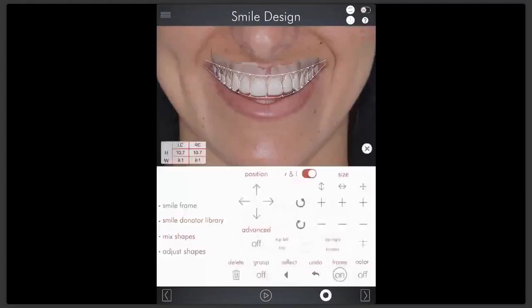So one thing that I want to mention and demonstrate in this training is that we don't necessarily need to do all teeth, right? For many cases, the patient is looking for only some teeth, or cannot afford the treatment, or the treatment itself only needs some anterior or even posterior teeth.